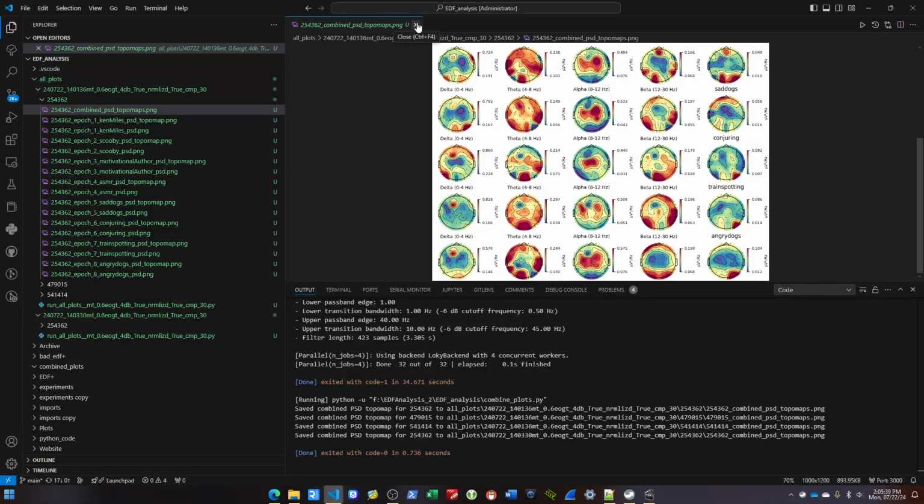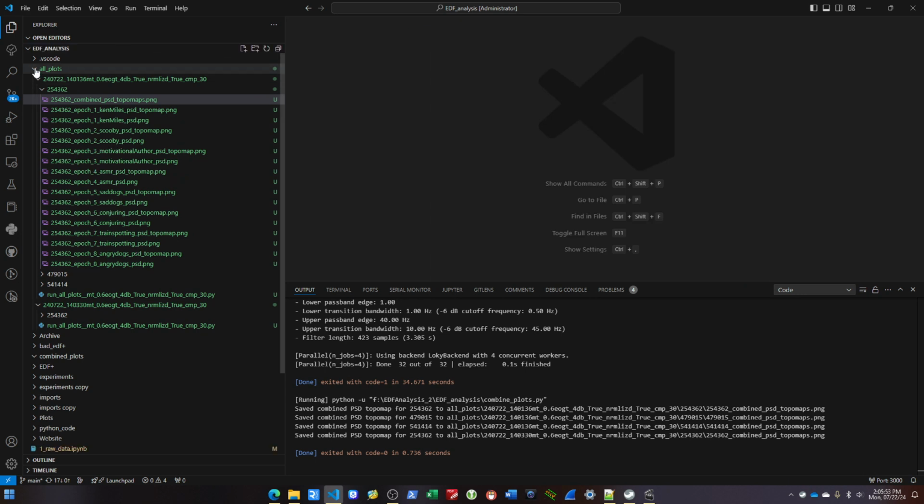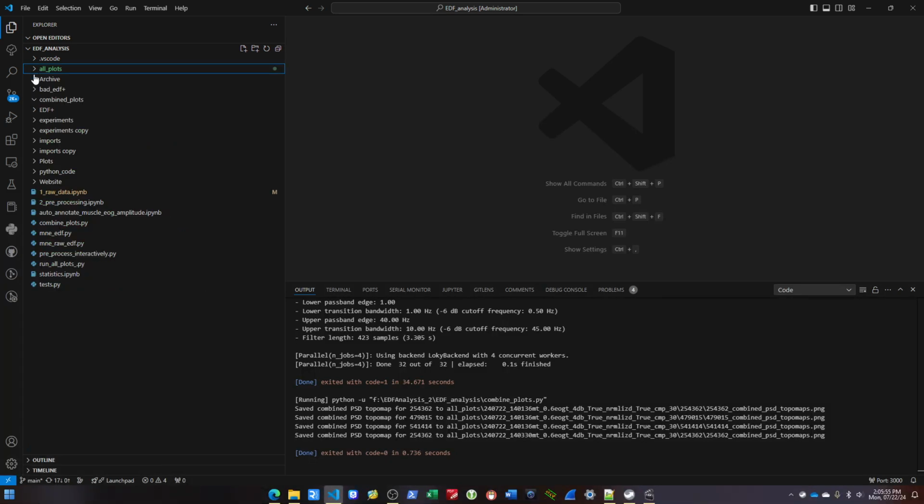So yeah, these should be all of the really basic pre-processing methods available through MNE. There's countless other ones as well. This is just a very brief, quick introduction and workflow of analyzing all of our data with the methods we currently know how to use.